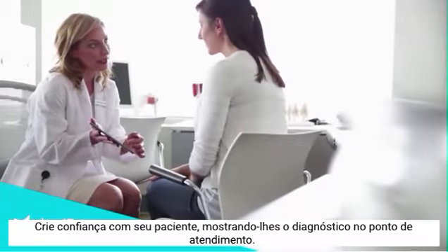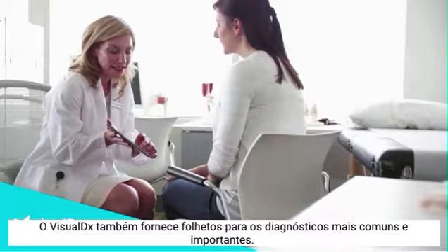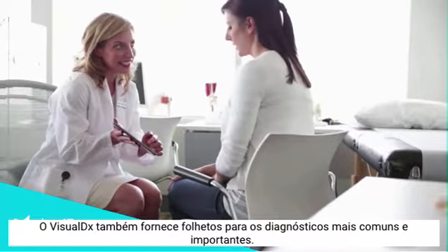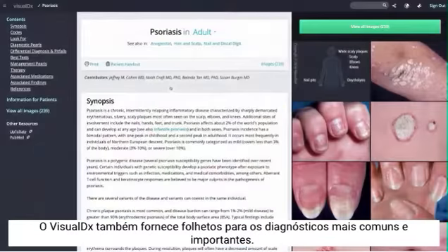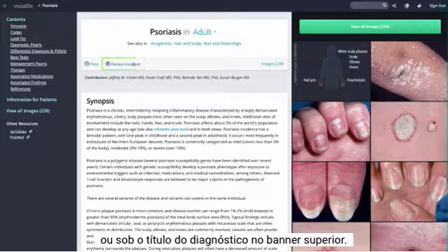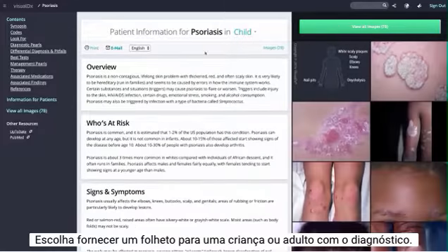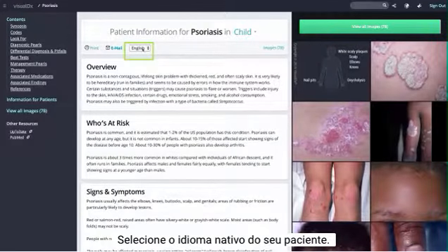Build confidence with your patient by showing them their diagnosis at the point of care. VisualDx also provides handouts for the most common and important diagnoses. Simply click Information for Patients on the left navigation menu or under the diagnosis title on the top banner. Choose to provide a handout for a child or adult with the diagnosis. Select your patient's native language.